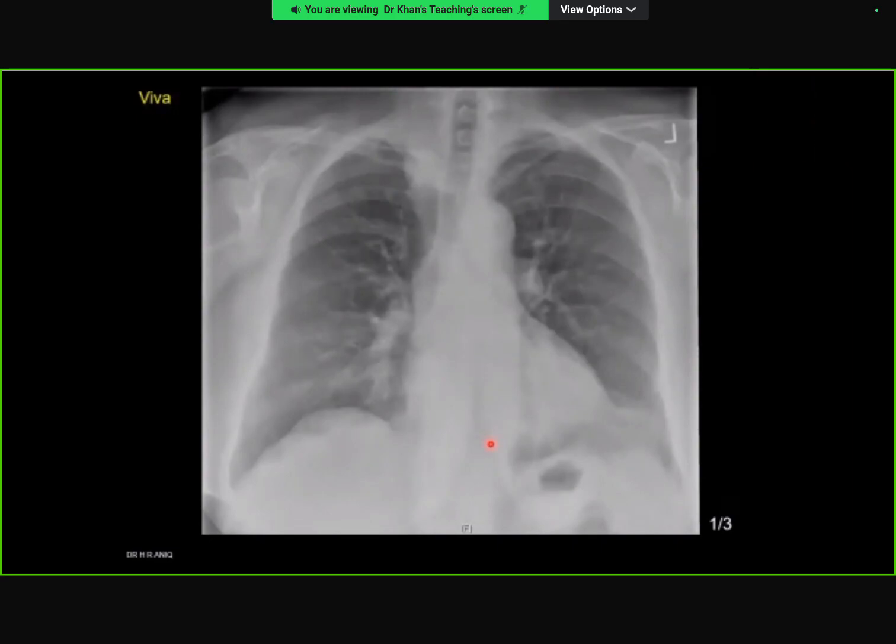This is also a classical 2B film, absolute classical. Again, a frontal chest radiograph of an adult patient. There's some atelectasis in the left lower zone, otherwise the lungs are clear. I'm not sure it's projected very well for me, but I'm trying to assess the bone. What is this?